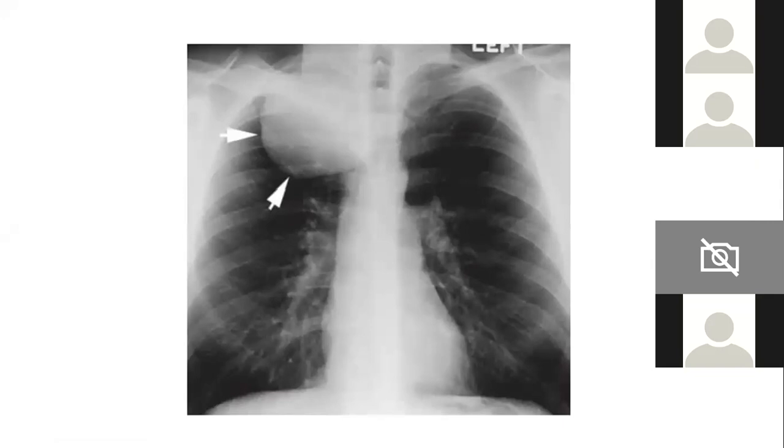So can you call it a mediastinal mass or a lung mass first? Okay, it's a mediastinal mass.